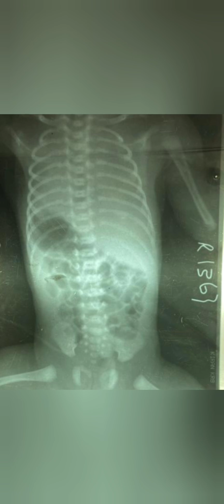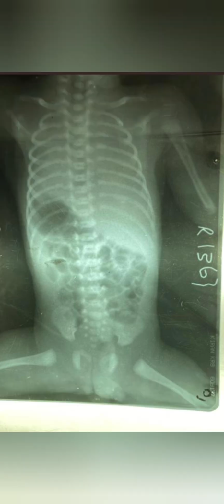What is this? This is again same thing, you have to mention this is a radiograph which is showing thorax as well as abdomen, but on the left side of the lung it is totally white out, or you can say on the left side of the lung, the black field which is usually occupied by air is totally white out. So this occurs because of the total opacification. You can also call it as hemithorax.